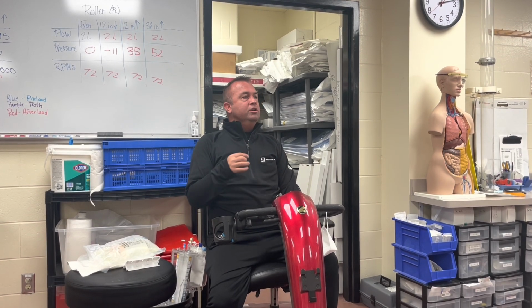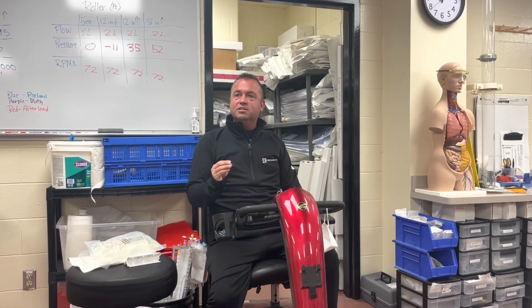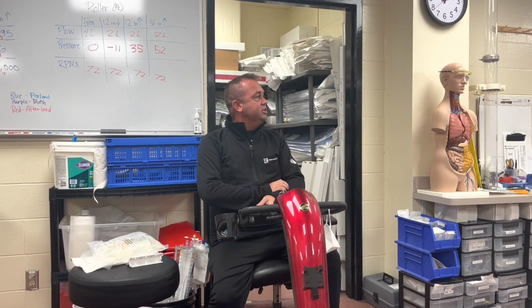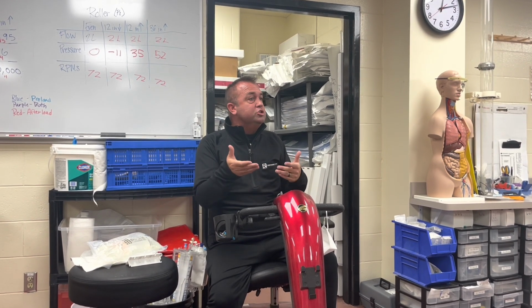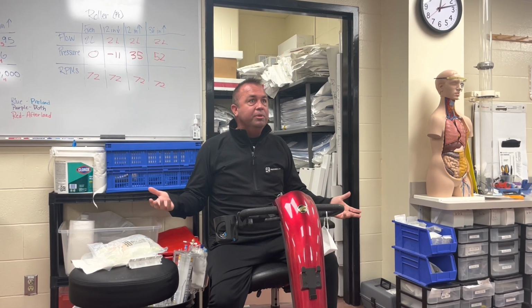I will ask you one thing. Knowing your anatomy and physiology, where would be the absolute best place to measure pressure? What's the biggest vessel where pressure is generated? Aorta. The central aorta, right off of the heart, right? Well, guess what we have, or not us, but the surgeon puts into the central aorta? The aortic cannula, right?